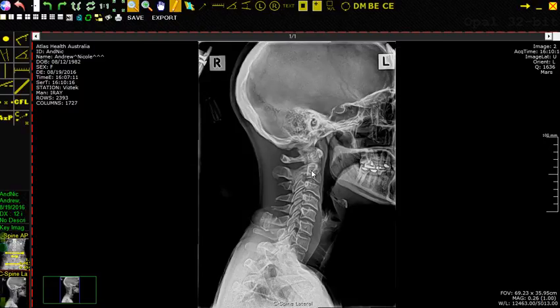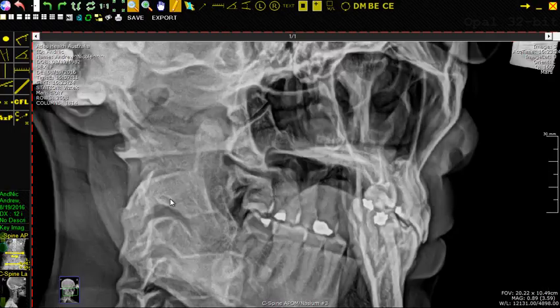Now, when I do my stereos, I will have normal collimation for doing it like a standard x-ray, but then I will cut the image prior to entering VizTech. And the critical thing is making sure that the bottom of the collimation field is exactly the same on both sides. Otherwise it gets a little bit messy. So let me just zoom down to show you exactly what I mean to the true stereos that I've taken. Maybe, if the x-ray is going to communicate properly.